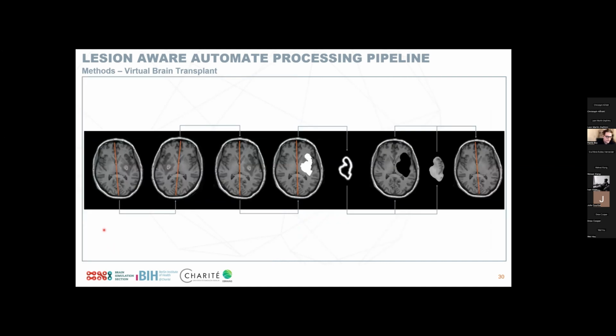And the way that we do this, because we use this idea of symmetry, is we basically take our input image and then we mirror it. And we can already see here the tilted lines in the middle, which means everybody lies inside of the scanner a little bit differently. Our brains are, of course, not perfectly aligned in the middle.